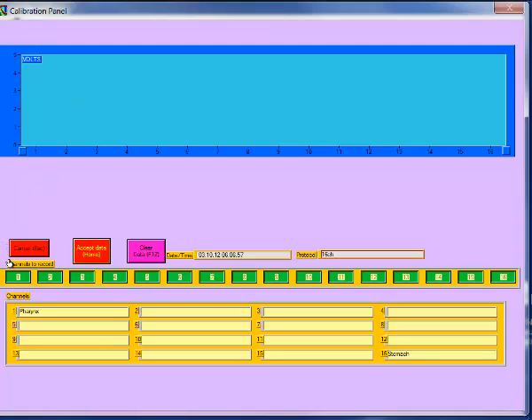The information at the bottom of the screen provides basic information about the recording catheter and calibration. Defaults for this can be set in the Calibration Defaults screen from the main menu. The channels display at the bottom allows you to enter text that you can associate with the recorded channels if you wish. The channels to record control determines which channels will be saved to the file. Normally all of these channels would be on, that is, green.